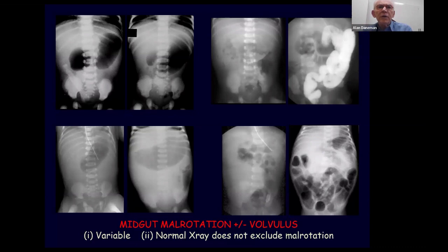Certainly, if these two patients are vomiting bile, the obstruction can't be in the stomach. It has to be beyond the stomach. So you still have to worry about malrotation. In this baby over here, you see the bowel gas pattern is normal, that is vomiting bile. When we did the enema and turned the baby left side down, you can see the gas from the stomach comes into the duodenum, which is dilated and obstructed, and tells you that this is probably due to intermittent distension of the duodenum from a malrotation.